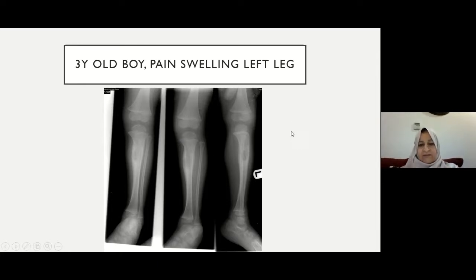The least favorable: if you reported osteomyelitis, however, tumor couldn't be ruled out, this will not help anyone. I will show you some clues. If you see this, you better ask for biopsy. This initial X-ray already shows a lesion, unlike osteomyelitis. There are X-ray changes at the time of presentation. The lesion is metadiaphyseal. It is lytic and somehow sclerotic, mildly expansile, with some cortical thickening.